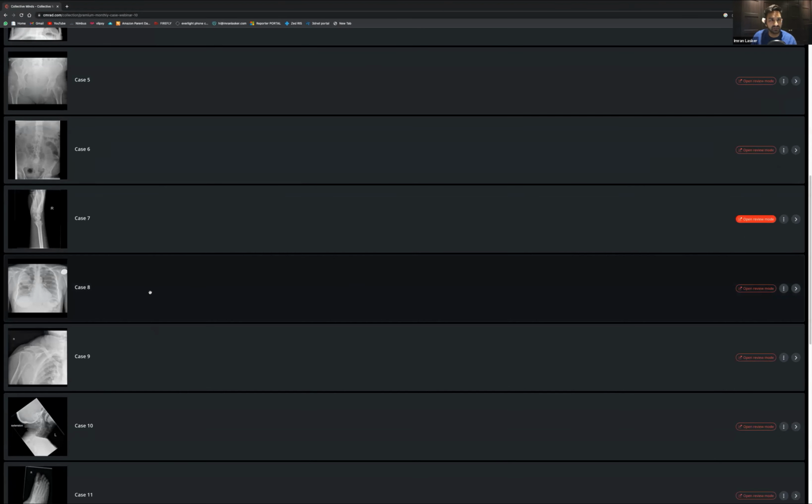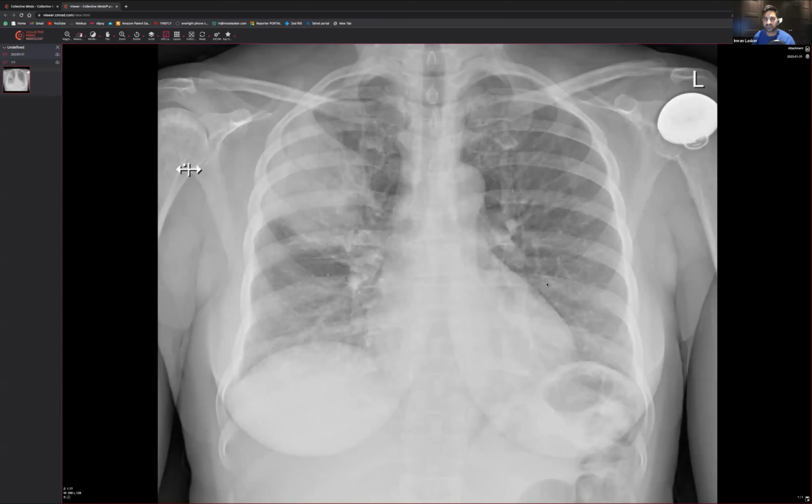Right. Okay. So doing very, very good. Let's have a look at this one. I've actually got a really great explanation for what this is saved up for you guys. So again, let's have a look at this X-ray. Hopefully something jumps at you. If it doesn't, don't worry, I'm going to go through it. So let's have a look.